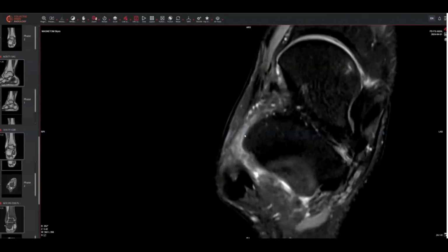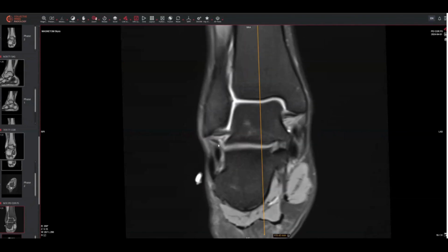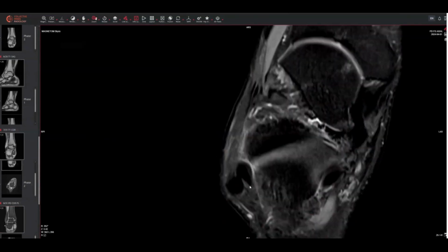And we are also seeing some synovitis looking for the calcaneofibular ligament now. We can see that often better in coronal images. We can see the tip as it attaches on the lateral malleolar tip. We can see a portion here, and then we are losing it in this location because of the thick slice of those images, and we can see it better over here. Again, let's pick up the dorsal aspect of that calcaneofibular ligament here.